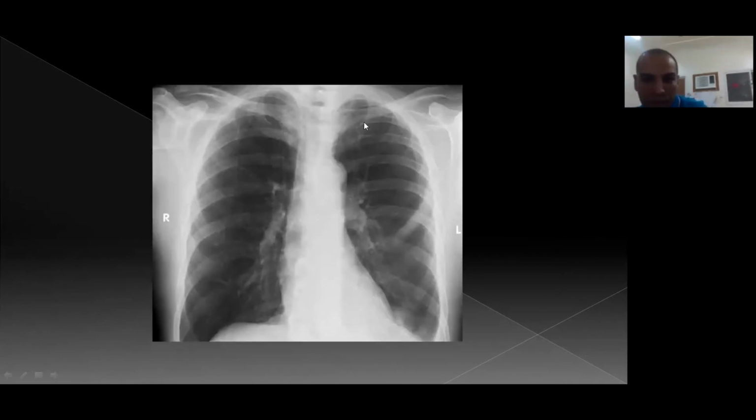For this one, this is the rib, this sclerotic rib. So we have here an abnormality. We have this rib: first, second, third, fourth, fifth. This is the left fifth rib. We can identify this rib if we make numbers from inferior to superior like this: 1, 2, 3, 4, 5. So this one is the fifth rib. So we can identify this one from above or from below.